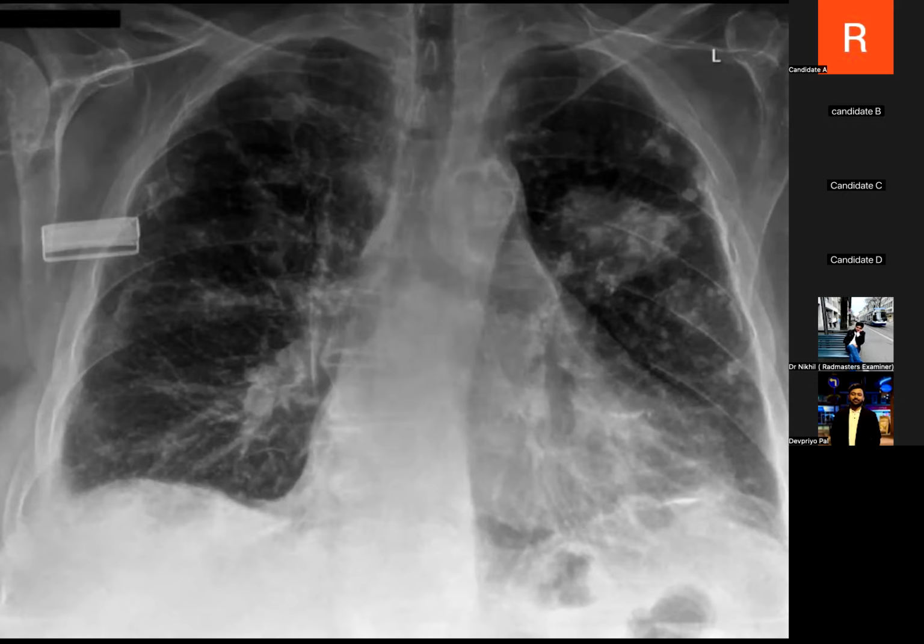So I would compare with any previous imaging available and also ask for any occupational and drug history for the interstitial lung pattern, and escalate this finding to the referring physician, and further suggest CT thorax with contrast to look at the mass, to further characterize the mass lesion as well as the background lung pattern.